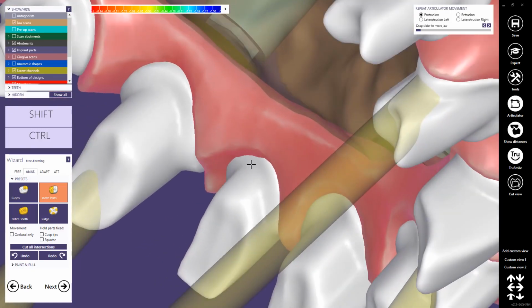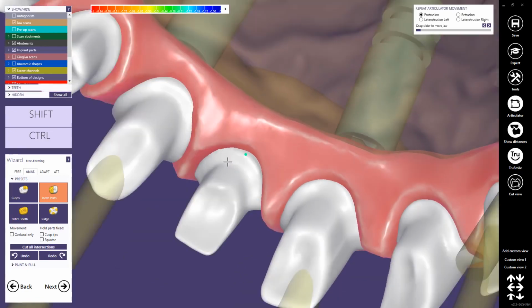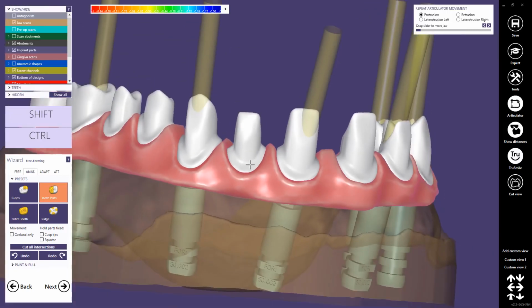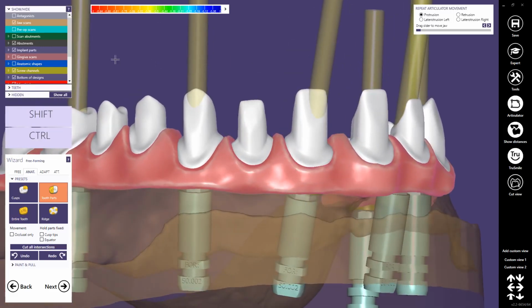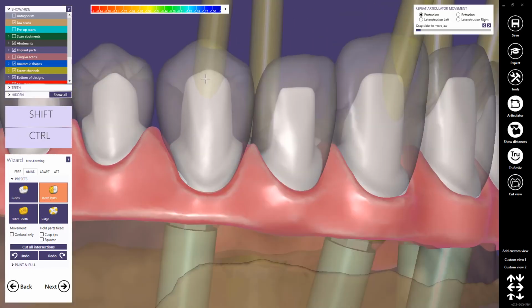So here's also still an issue. Okay. Then we will check now if there's enough space to the anatomical shape. Yeah, for example, here we could reduce the thimble. We can also fix the equator.